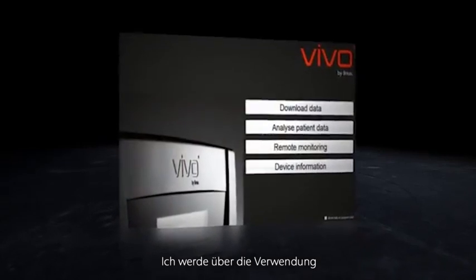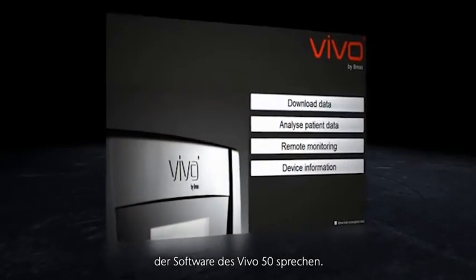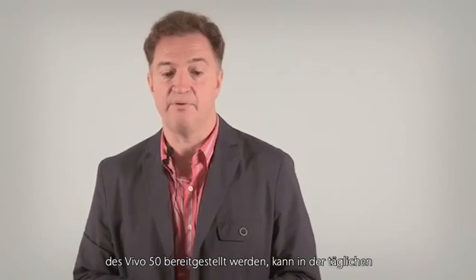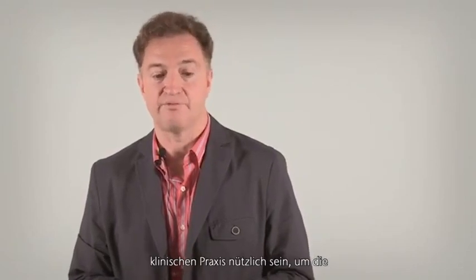I'm a senior physician specialist in respiratory medicine and I work in the Hospital de Sabadell, Corporació Parc Taulí, Spain. I'm going to speak about the use of the software of the Vivo 50. The use of the information provided by the PC software of the Vivo 50 may be useful in daily clinical practice for adjusting non-invasive ventilation.